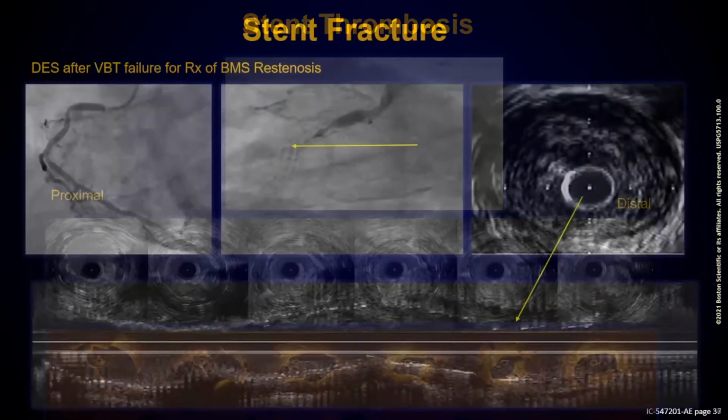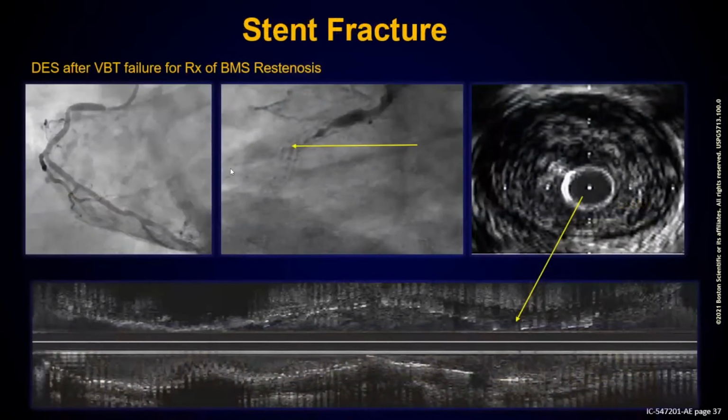So we all talk about stent fracture, but it is sometimes very difficult to appreciate stent fracture on angiography. If you want to look at stent fracture via angiography, the best thing would be to do a stent boost.